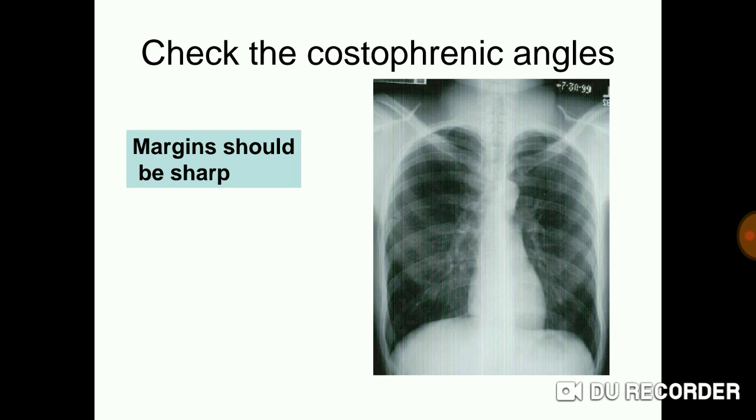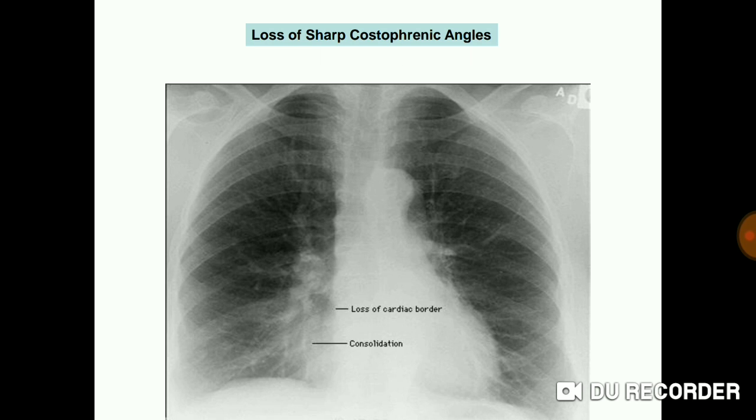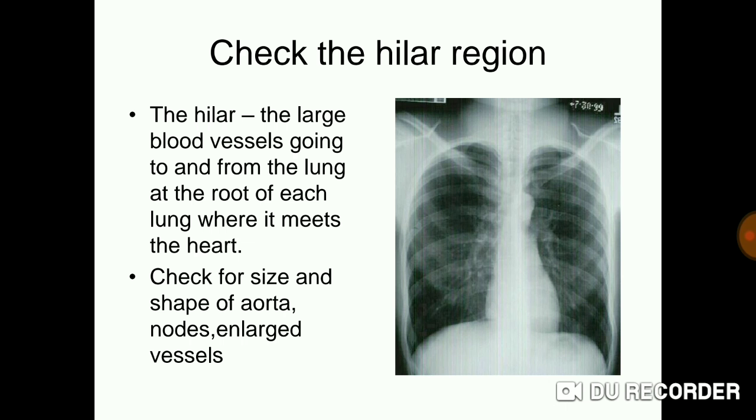How will we check the costophrenic angles? Margins should be sharp. Loss of sharp costophrenic angles. This is the X-ray of loss of sharp costophrenic angles. You can see in this picture.